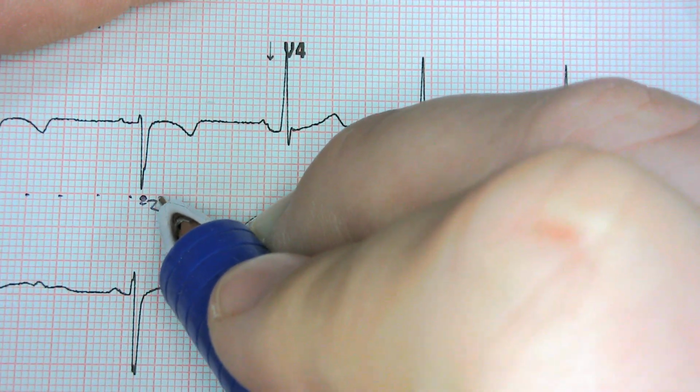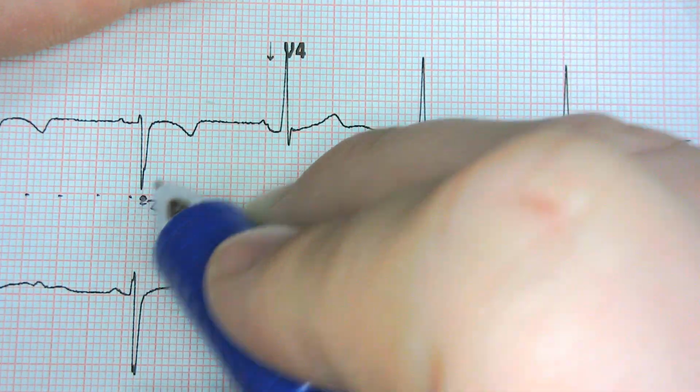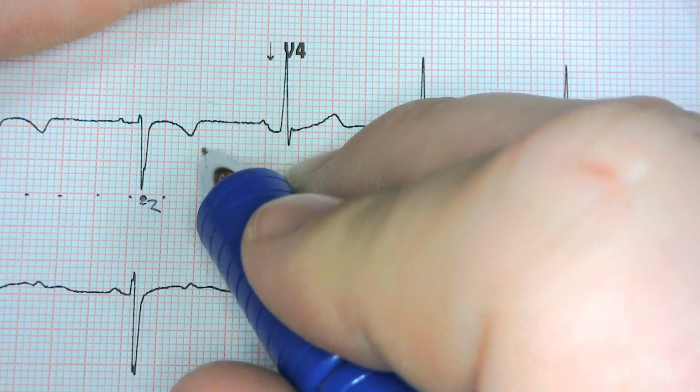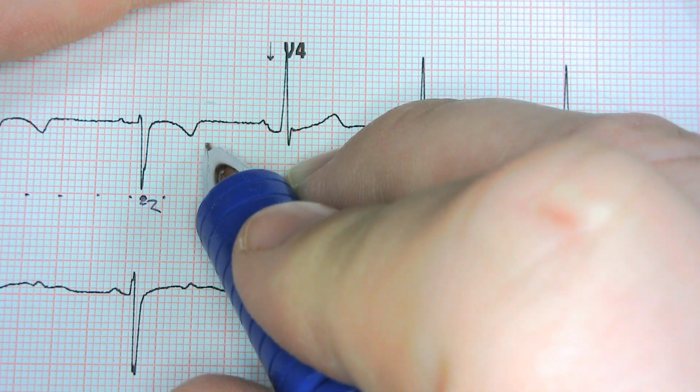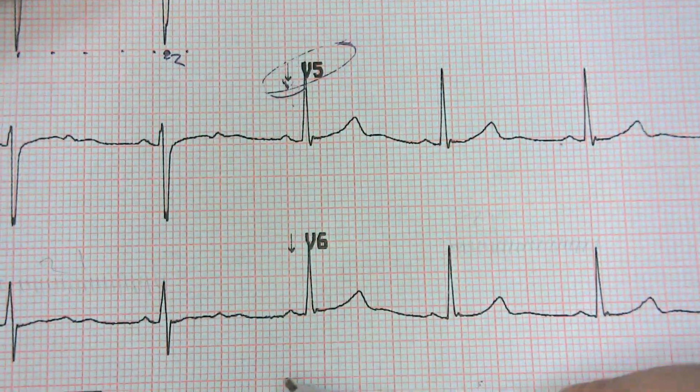All right. So let's see. 0. We haven't gone anywhere. Look, we're going down to up. I don't like doing these down-up transitions. Does that make sense? So is there a way that I could go down, down, or up, up? Well, let's look right here. Once again, kind of a down, up.